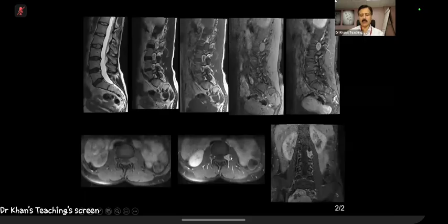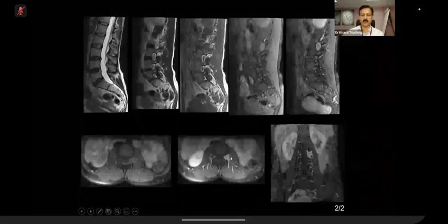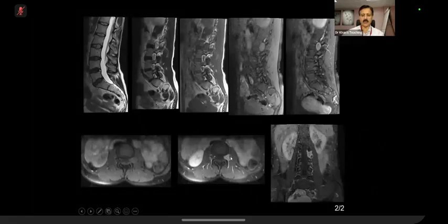You remember that I'm going into the world of CP angle tumors here. In the brain, when you see a CP angle tumor, schwannoma versus meningioma, you remember I told you various discriminators. And of course, one of the discriminators is that meningioma can have calcification. It can cause hyperostosis of the skull if it goes in.